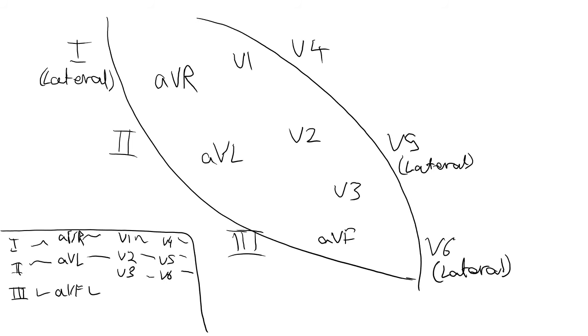Now, lead 2 and lead 3 are getting more so towards the inferior side of the heart. Lead 3 is pretty much on the bottom of the heart. So lead 3 and lead 2 show if there is an inferior infarction occurring. AVF is pretty much on the bottom of the heart as well, so we can include that as an inferior infarction. AVR, as you can see, pretty much is in the right atrium, but it's in a place where nothing really would infarct. The right atrium is not really an oxygen-hungry part of the heart. So as you'll learn, if you see an AVR ST elevation, that does not show anything. If there's an AVR ST elevation, you can pretty much say that there's no damage occurring to the heart, and an AVR ST elevation pretty much doesn't occur.